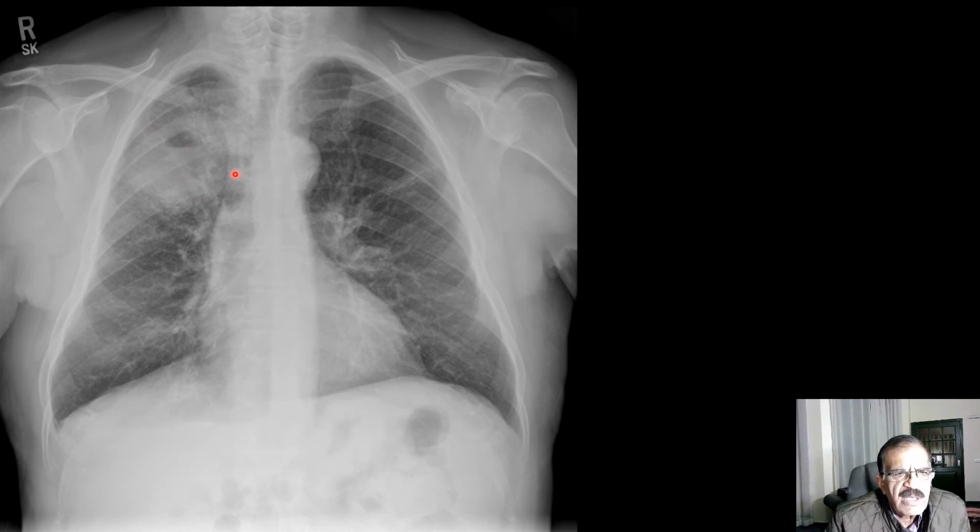Theoretically, you could also say that this is an abscess which has just started draining, but to me this looks more like a malignancy. Of course, it would depend on the clinical scenario. You might need sputum cytology, sputum for AFB, CT scan, or bronchoalveolar lavage for the proper diagnosis, but the first look is very suggestive of malignancy, particularly if this patient is a smoker and the patient has clubbing. I would consider malignancy as the most likely diagnosis.